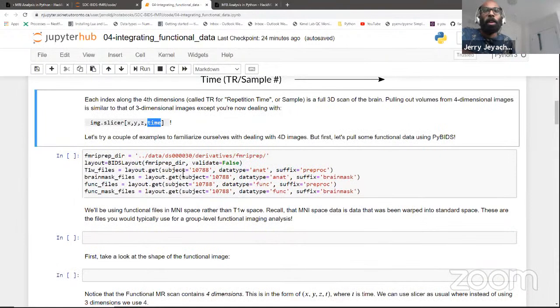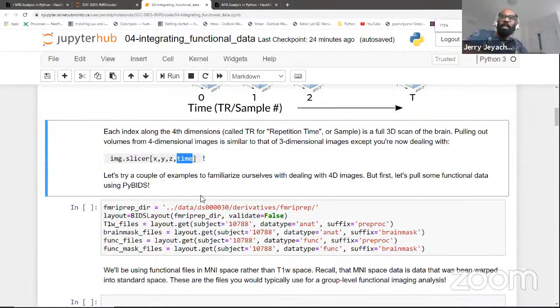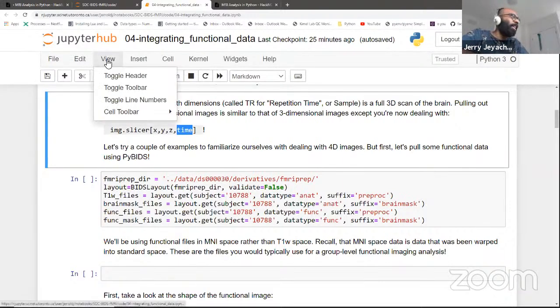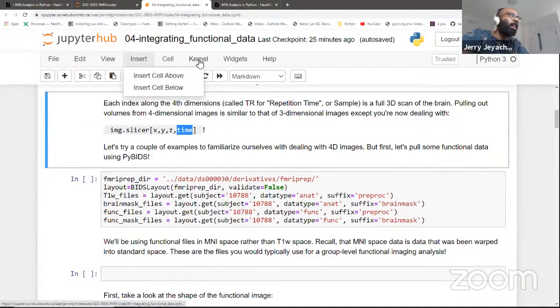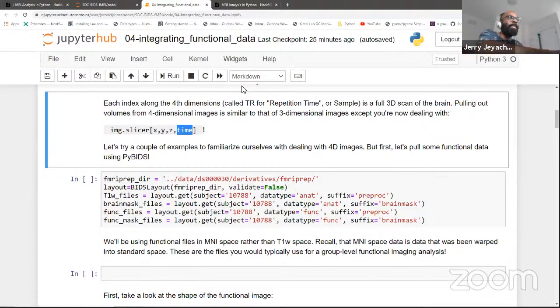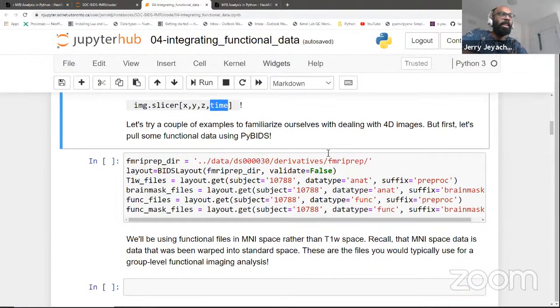All right, so we have some boilerplate code that is here, so you don't have to go through. Yes, I can make the text bigger. All right, how's that look? OK, so what we're going to do first is a little bigger. OK, let me see if I can do this in a way that doesn't cut off. I might not be able to, but I'll just make the text. All right, text, you're going to be even bigger. All right, how's that look?